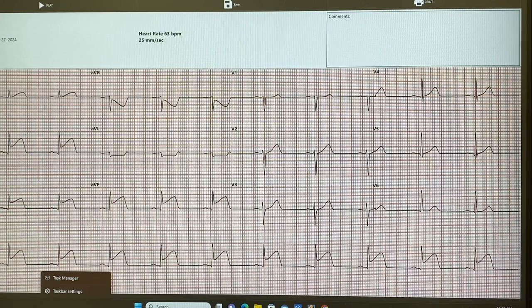Next, I'm looking at the T wave. Not yet. ST segment. ST segment. There we go. That was the fun part. ST segment, what are the options? And remember, we're only looking at lead 2 right now. So is it at baseline? Is the ST segment at baseline? Is it elevated or is it depressed? It's elevated. How elevated is it? So 1 small square is how much?